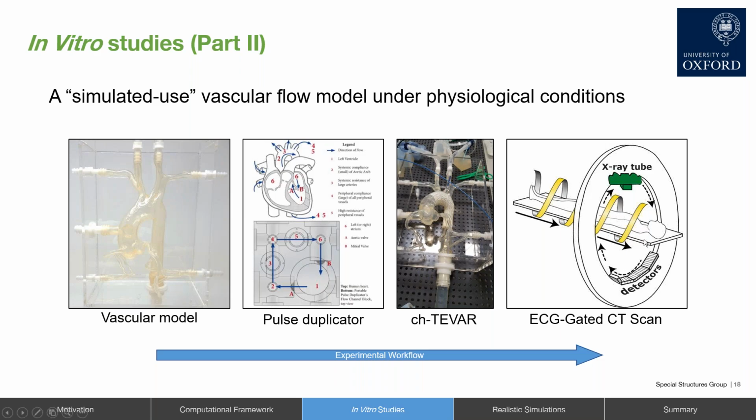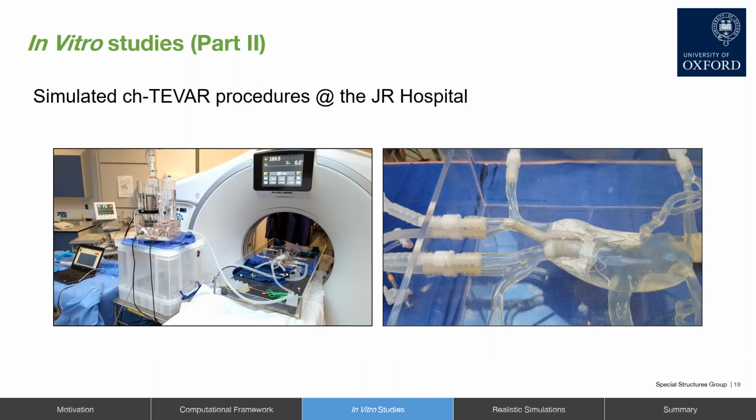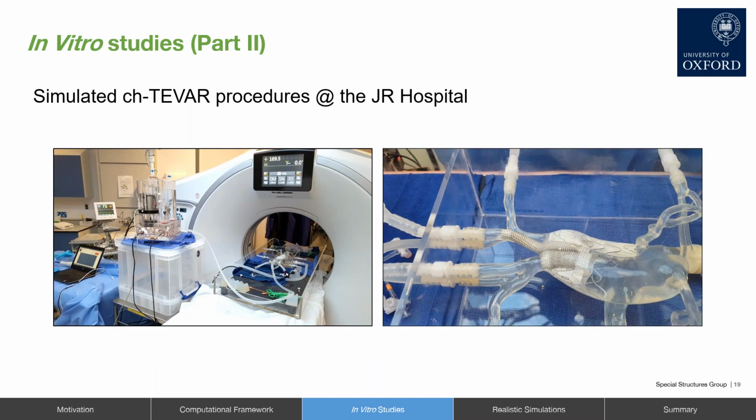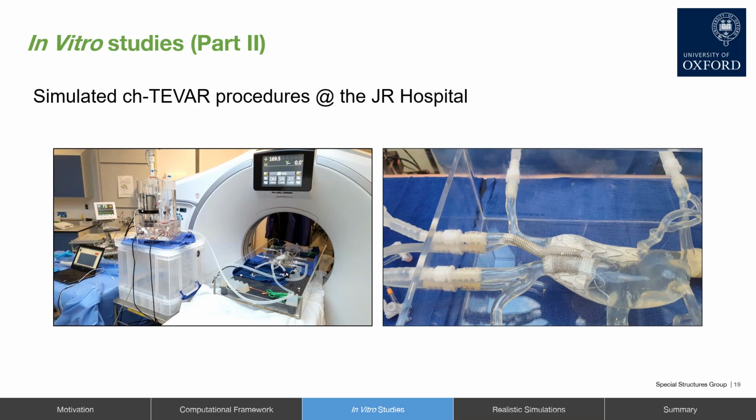And what we've done is we've taken this setup and taken it to the hospital where we can perform equivalent ECG-gated CT scans to really look at specific phases of the cardiac cycle. So here we see the realization of the setup at the John Radcliffe here in the hospital, with the video on the right demonstrating the pulsatile nature of our setup.